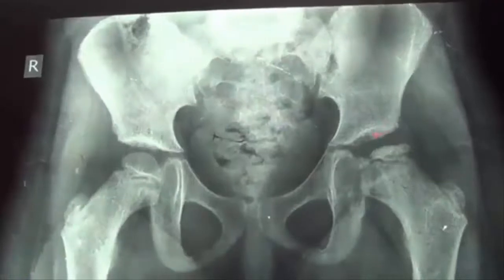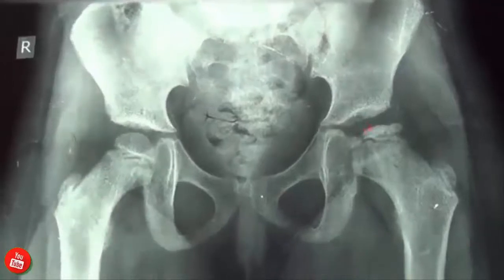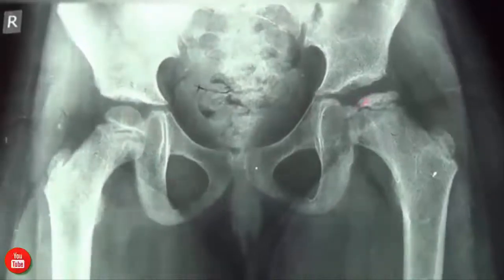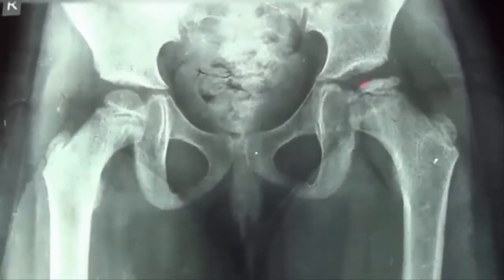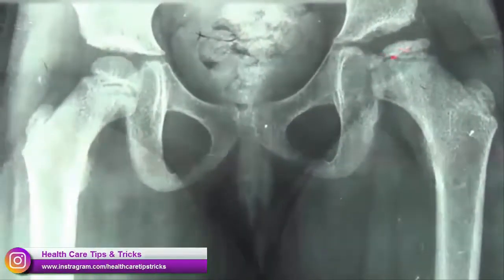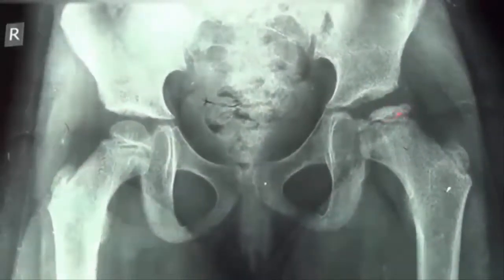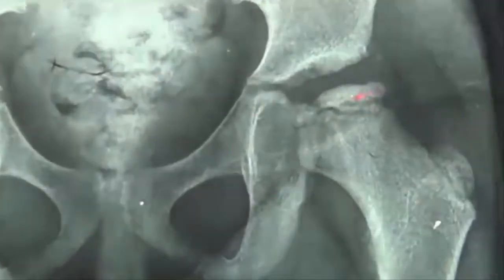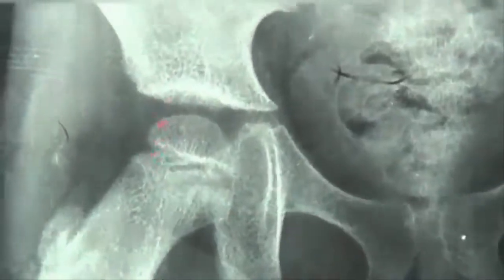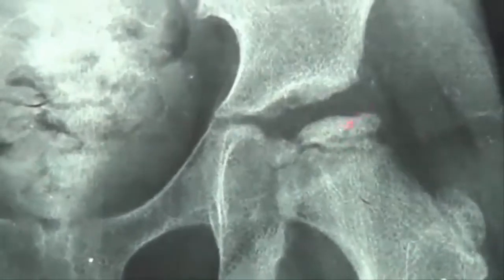Since the X-ray for the girl suggested Perthes disease, we decided just to observe, because at that age most of them have a very good follow-up. This X-ray is 6 months later, and you can see that it has developed into a very bad Perthes disease. You really see the height is very down. The lateral column is really small if you compare it with the other side. This is the lateral column, and this is probably a Herring C on a very bad scale.